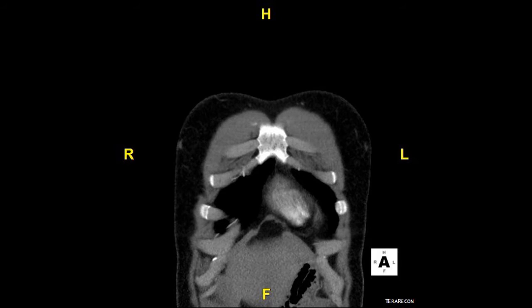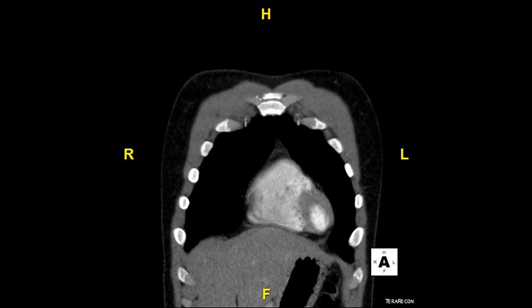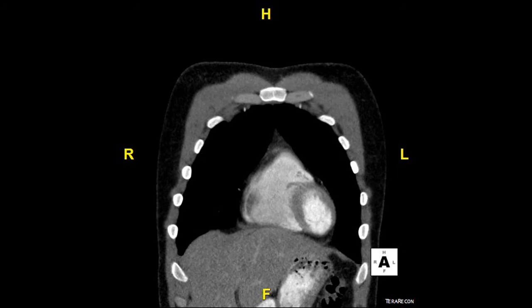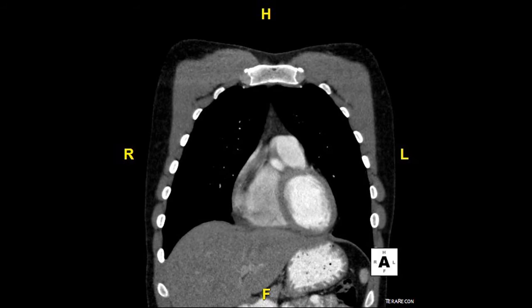Here's something starting to come into view in the thoracic cavity. Think about what the structure could be while we scroll through some more images until it becomes a little more defined. This new structure coming into view is the heart, and we're starting to see the left ventricle right now, which I'll outline quickly here in blue. A few more structures will start coming into view in the next few slides.